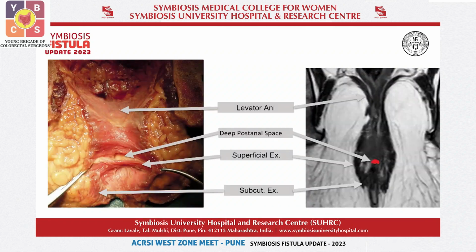Okay, we'll just go back and see once again on the other sequences. I just wanted to reiterate here that this is something new for us also. It is something called the deep post-anal space, which is located in the 6 o'clock position higher up in the anal canal.